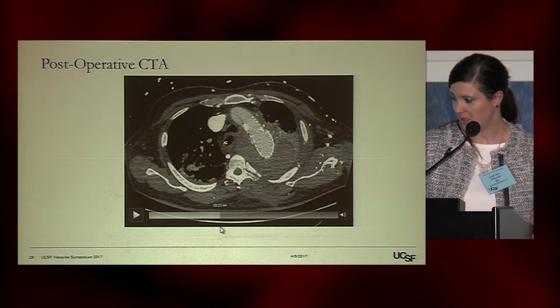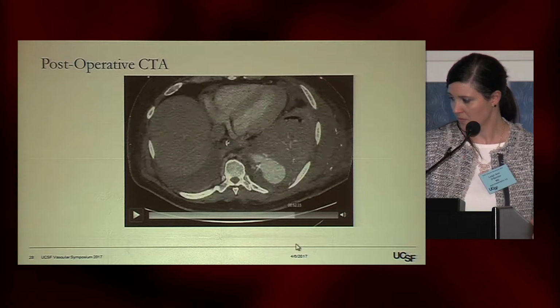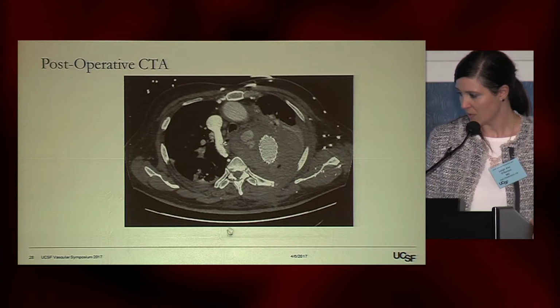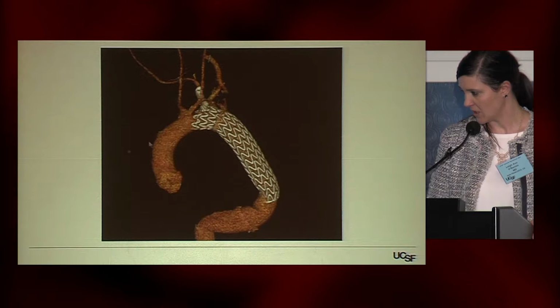So you can see there's still a large type 1 endoleak. And these are just some more slides showing the leak here and here. And that was kind of the reconstruction of.